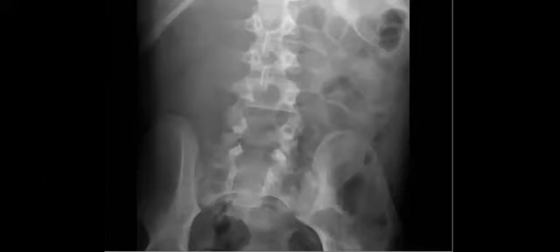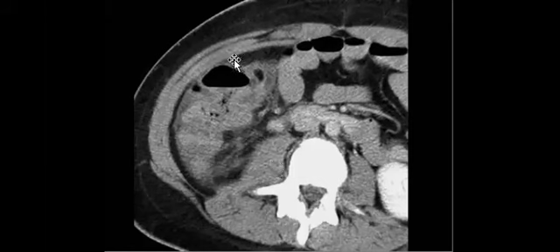like chemotherapy, for example, what could it be? Leukemia. Yes, perfect. 10 stars. So if I show you this one, it will be easy. It looks like appendicitis, but in a pediatric age group with very much stranding, and maybe you can find some collection. So what is the location of typhlitis? Where is it?